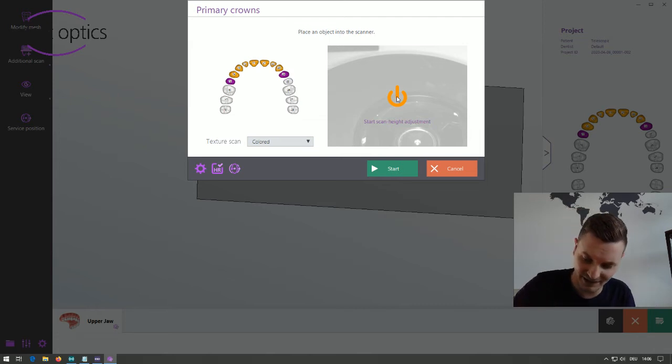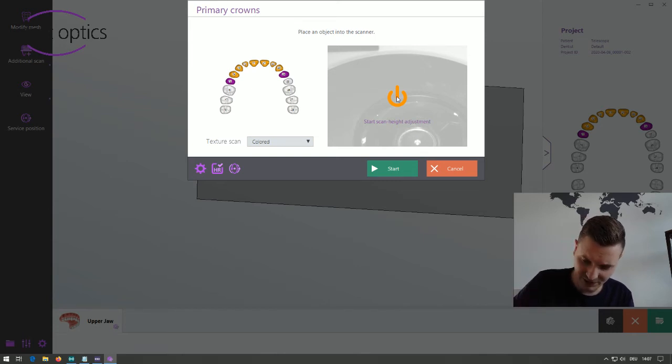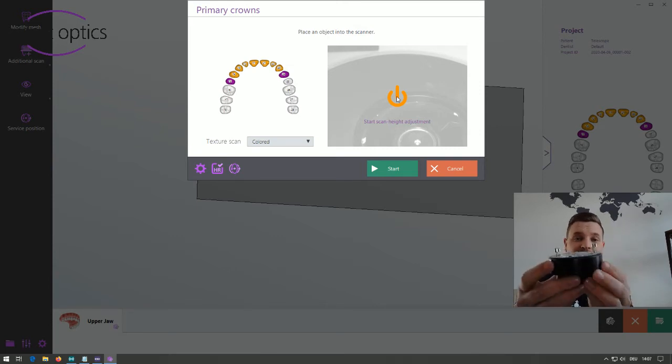I can add them on my screws. Another one. Then I just choose or put on my crowns. A little bit tricky in this case. Like this. Have a look at this. And now I need to spray it again in my box.